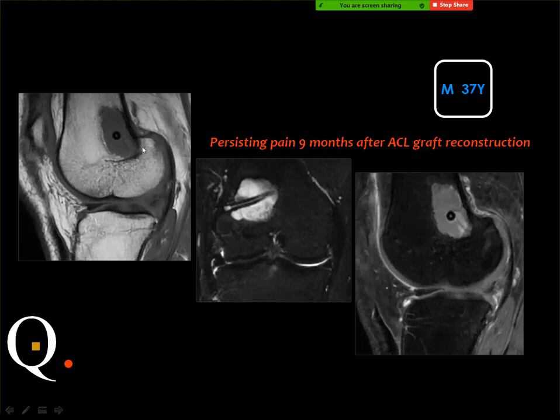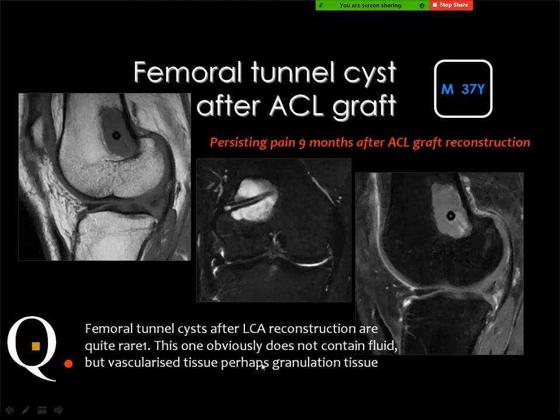Yes, this is the lesion, and you remember that one of the complications of ACL reconstruction is development of a tunnel cyst, and this tunnel cyst means that there is an accumulation of fluid around the femoral tunnel or the tibial tunnel or both. And according to the literature, this is not an indication to reopen or redo the case. This cyst will heal, and the screw is not loose from its place.